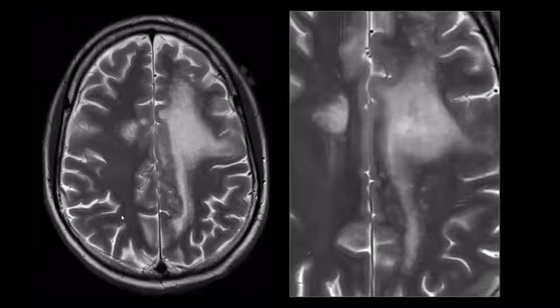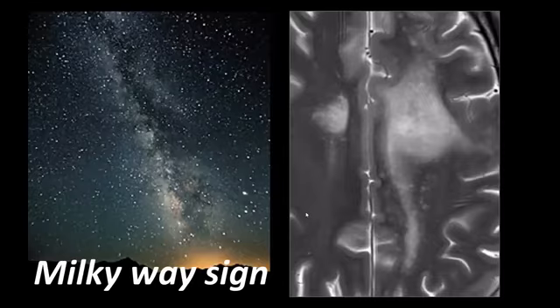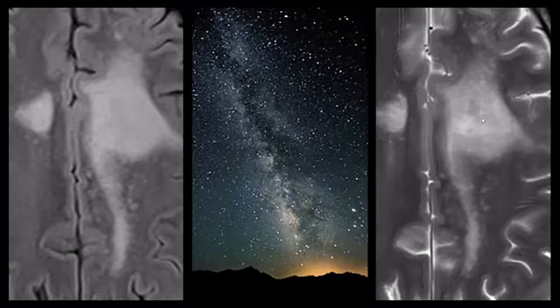Let's magnify these images a bit. We see here the area of demyelination, and we see the many little stars surrounding it. The total image looks a bit like the Milky Way, which is why we call it the Milky Way sign. I also find this a useful sign, the small dots. Basically, we have the large area of demyelination, and the small dots correspond to the infection spreading through perivascular spaces to other parts of the brain or to the white matter surrounding the main area of demyelination.